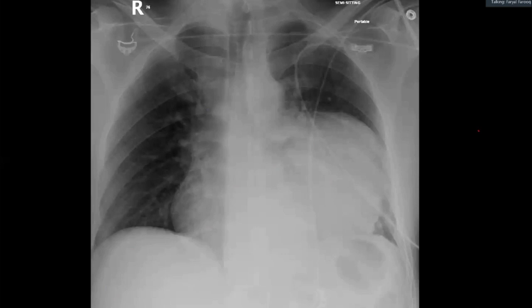It could be, it doesn't look into the pleura. The other thing that's left is pleura. I don't think it's in the pleura because it's not making an obtuse angle. Its epicenter is within the lung, within the thorax, hemithorax. So I don't think it's within the pleura.